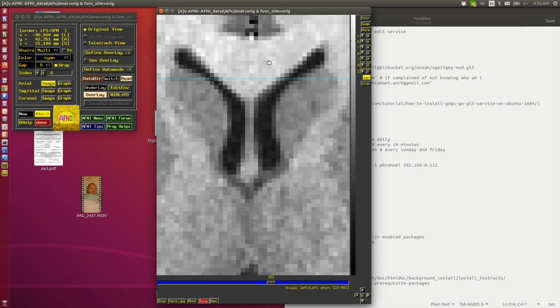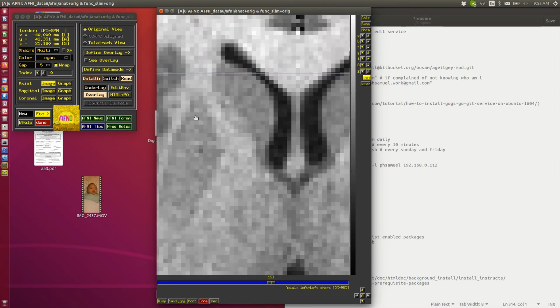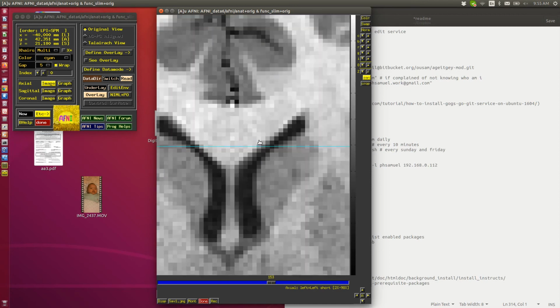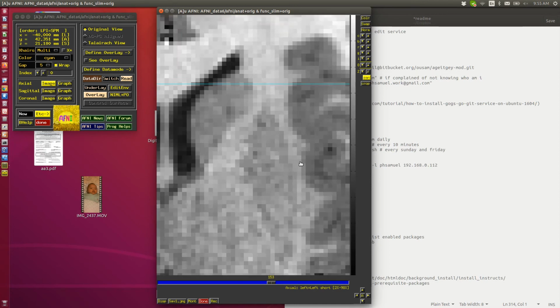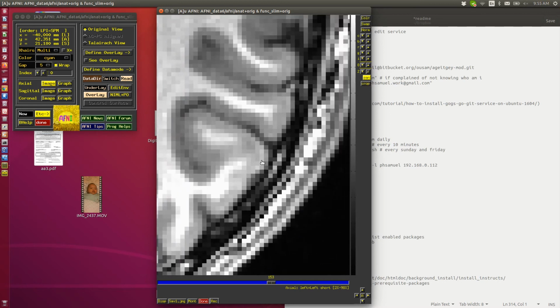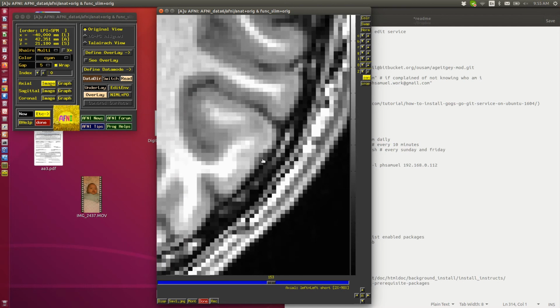then the cursor should change shape to this hand, and you click and drag, you can drag it around to see the portion of the zoomed image through this portal of the image window. Say for some reason you love this gyrus sulcus here. It's beautiful.